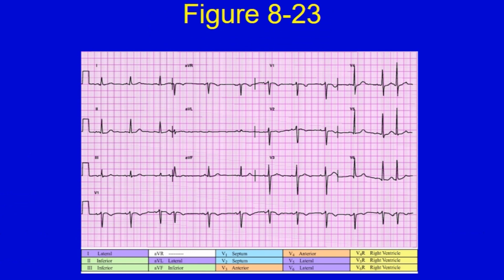Now remember, we're looking at V1. Will the P wave be upright or upside down? It's not a lead 2. That's what we learned how to read so much in, okay? This is V1. I know you do this just to mess with us. Yeah, well, yes, of course I do. All right. So it's really a sinus rhythm with PACs.